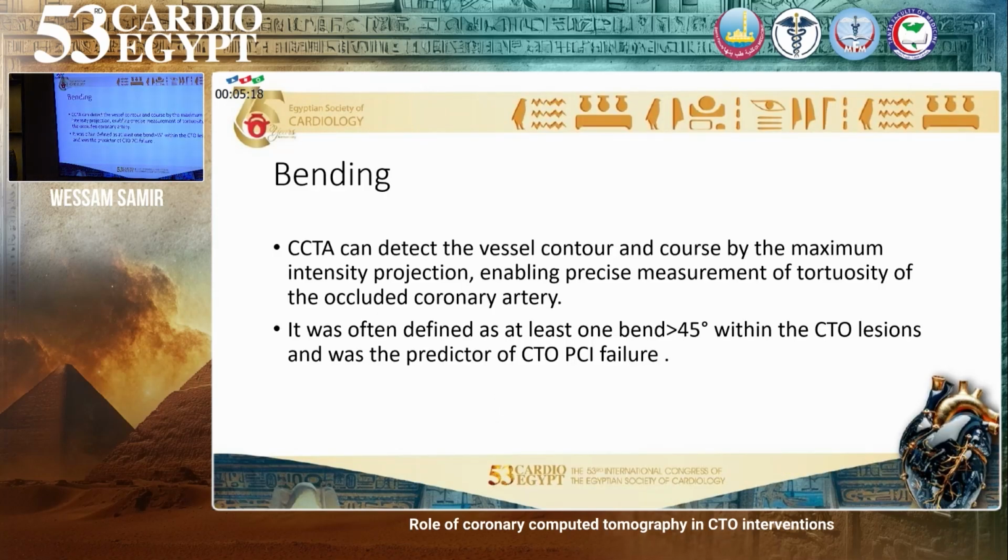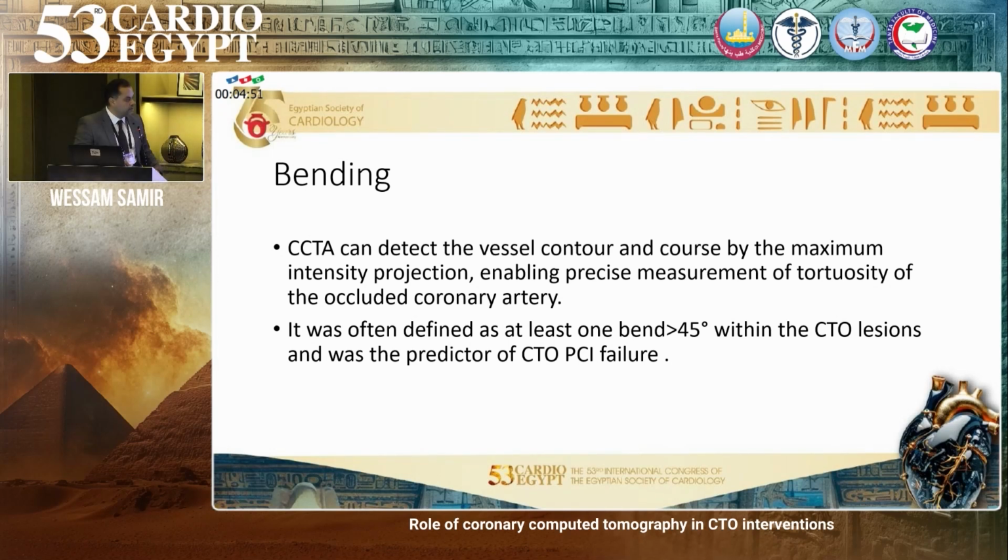Bending. CT angiography is very useful in detecting the vessel contour and the course of the vessel, enabling precise measurement of the tortuosity. And it was found that a bend of more than 45 degrees in CT coronary angiography was a predictor of CTO failure.